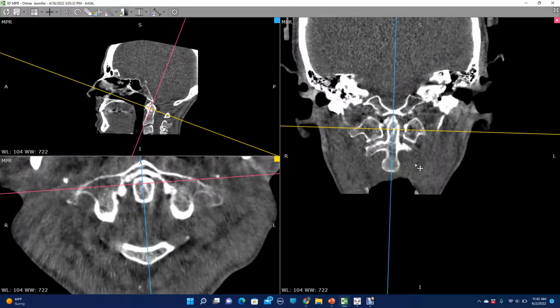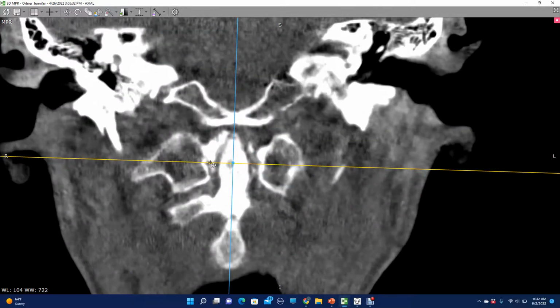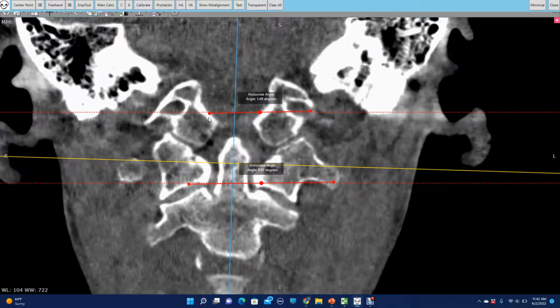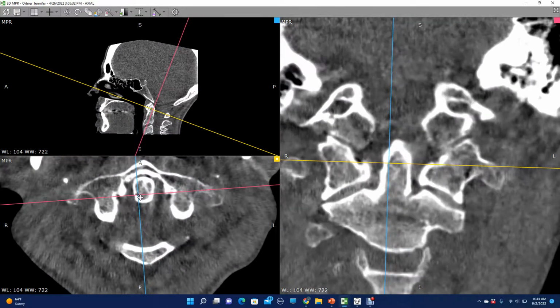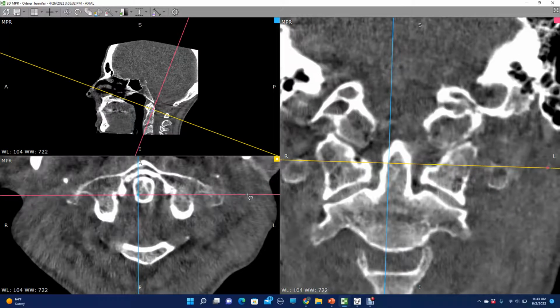And so when we look at the plane of the atlas, when we're oriented through the center of the skull, as would be a traditional frontal, we're going to have a plane line up here and here. But if we took this view, and instead of looking at it through the skull, we were looking at it through the atlas head-on, would that change our measurements?